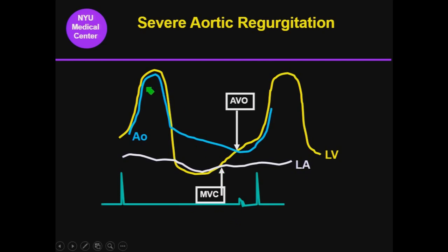But there is another thing that also happened. If you look here, this is the aortic pressure. And if the aortic pressure in aortic insufficiency falls very fast, then toward late diastole, the pressure in the ventricle goes above aortic pressure. And this opened the aortic valve prematurely. M-mode can show you this very, very well, probably better than any other technique.